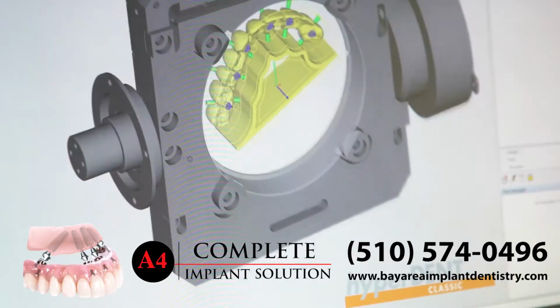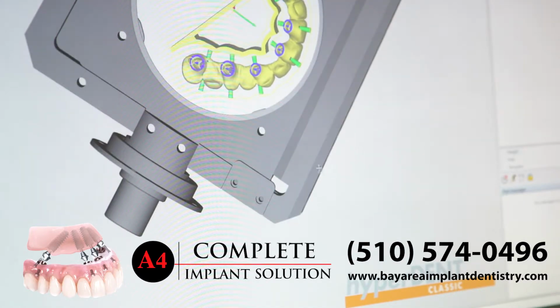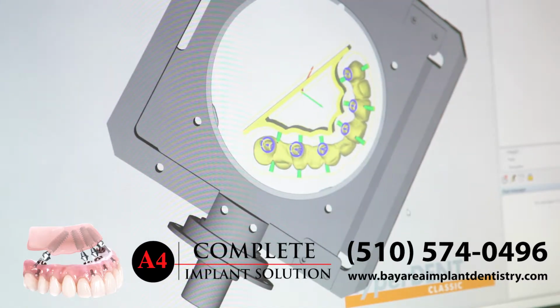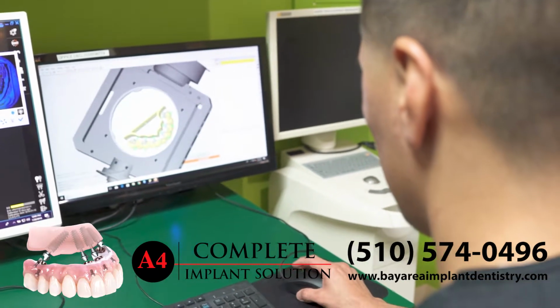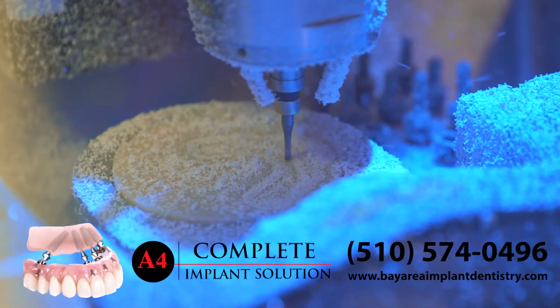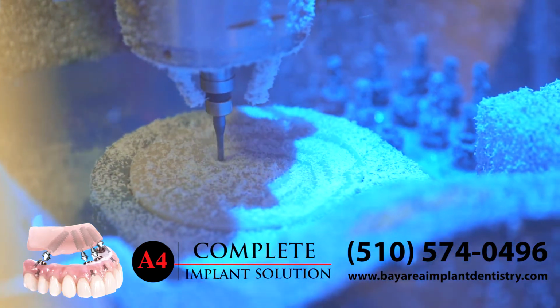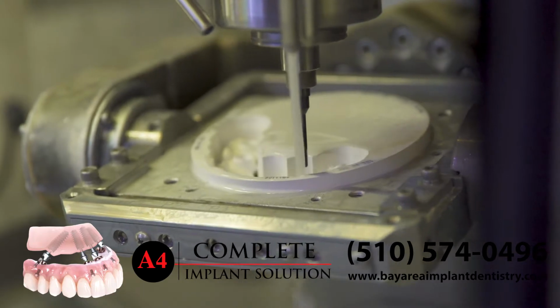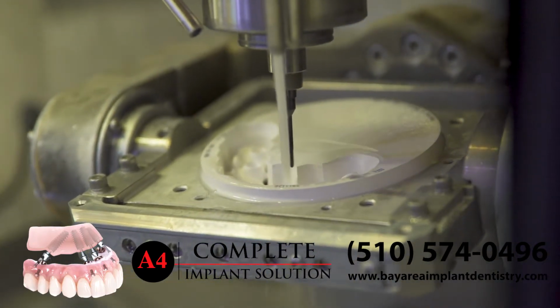Once the designing is done, then the design has to be produced in 3D into a material that you can touch. In order to make the things on the screen a reality, it has to go through CAM software. The CAM software tells the CNC machine how the drill is going to move, what tool is going to be used, what path, what trajectory the tool is going to be taking in order to carve that part out from a solid disc.